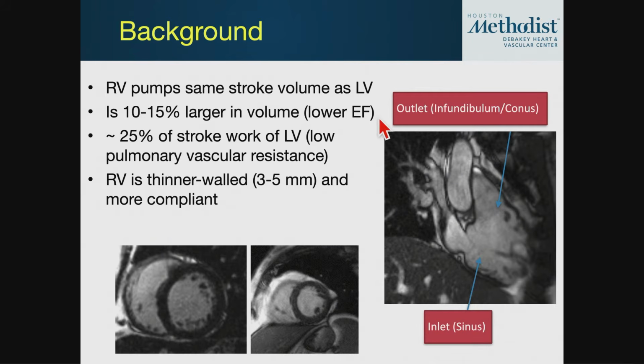Now, important to also recognize that the shape of the right ventricle is a little bit different than the shape of the left ventricle. It's got a unique shape, and oftentimes it's hard to directly image the right ventricle in any given view.